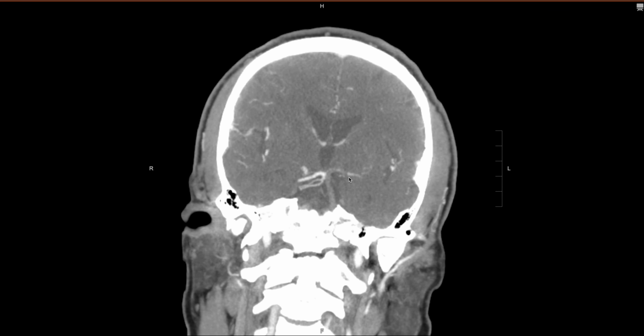So really the bottom line is use your axial and coronal imaging together to trace your vessels in a systematic way, and don't neglect the posterior circulation, and make sure you look throughout the entire basilar artery. This case is not necessarily the most subtle. However, sometimes you'll see the opposite situation where it's just the basilar tip thrombus, and maybe it's just going into a PCA, but the rest of the basilar opacifies, and they sometimes can be very difficult to pick up, especially if you don't look at the coronal.